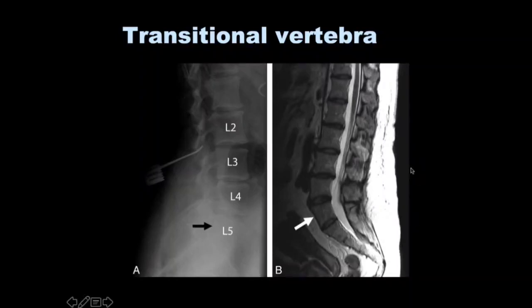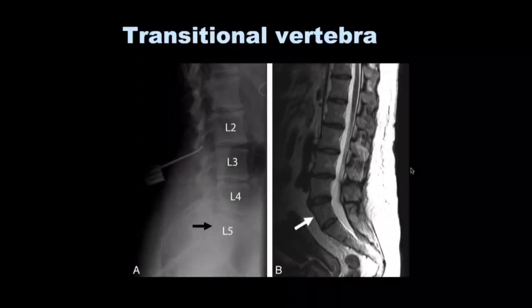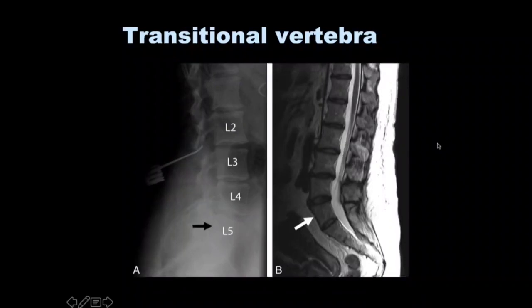And on the CT scan itself, if you window it properly on the soft tissue windows, you can actually look for any significant spinal canal stenosis. The other thing is that if there's obviously an osseous abnormality with an extra osseous soft tissue component, that can be picked up on the CT scan. And sometimes contrast enhanced scans also help, because that kind of outlines the soft tissue component. Within the tumor itself there might be a bit of enhancement, and that helps you to separate it from the rest of the CSF space.